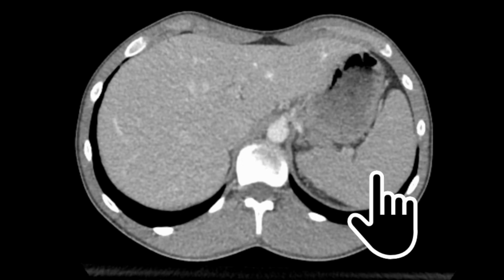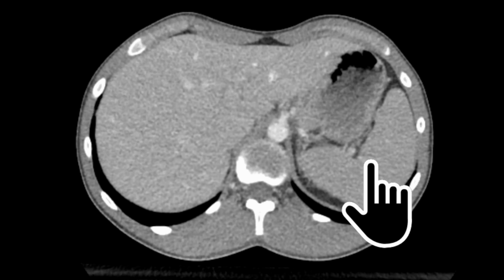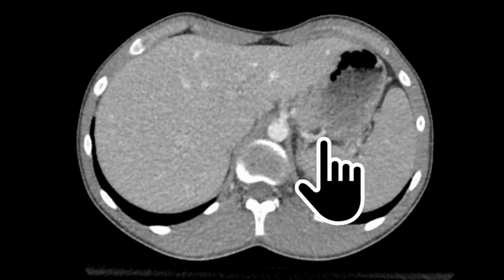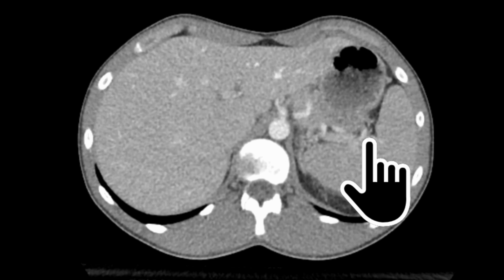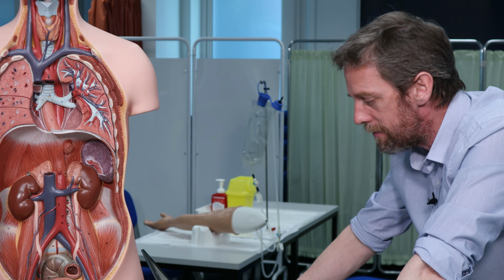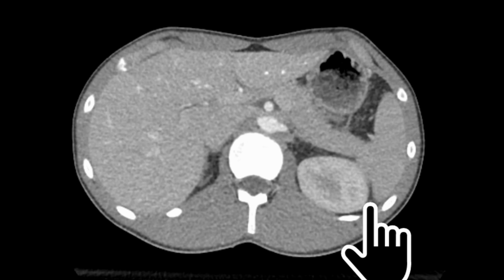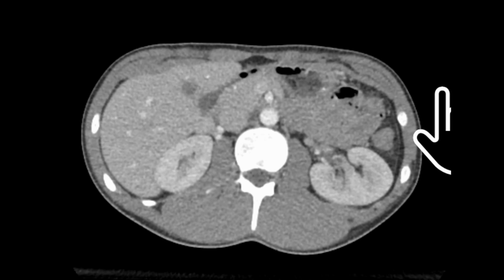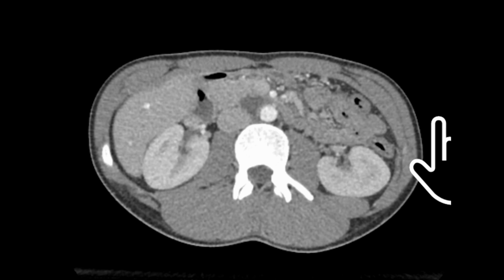And yeah, we're seeing some of the blood vessels here. What does this look like? Does that look like a wiggly artery running towards the spleen to you, the splenic artery that's also supplying blood to the pancreas as it goes? Anyway, I said I wasn't going to do too much detail, didn't I? So liver, stomach, spleen, pancreas, kidney, vertebrae, major blood vessels. And then we've got the large intestine and the small intestine.